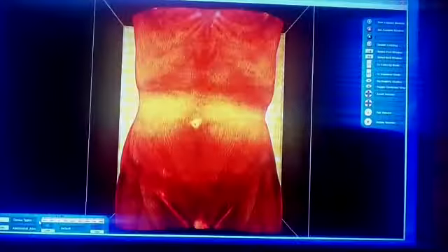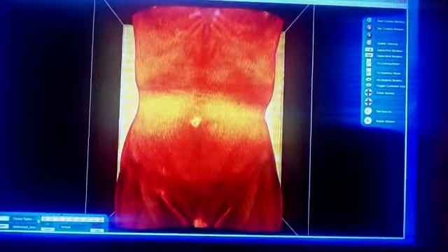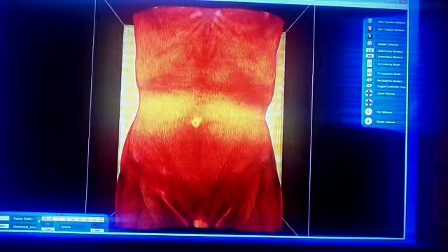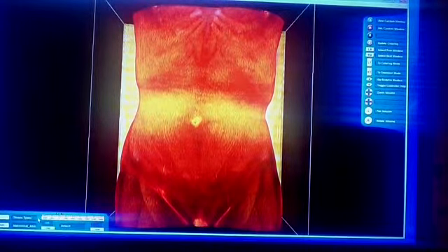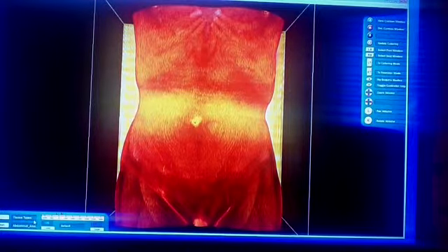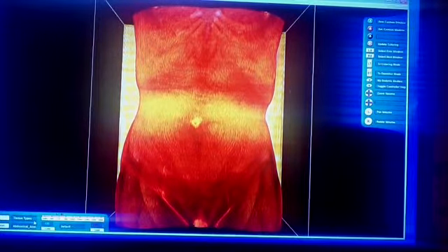What we're going to do today is demonstrate the ability of the Vutek system to analyze a spinal column. We're going to start with his body and then go inside and analyze the spinal column. What we'll do first is to change the tissue types. By doing that, it ignores skin and looks only at bones and muscles. So we'll do that first.